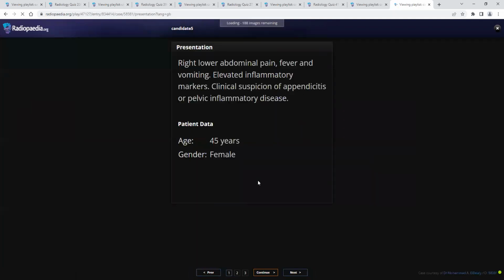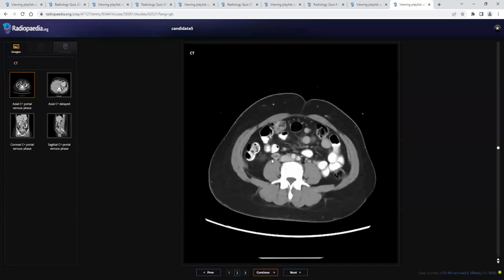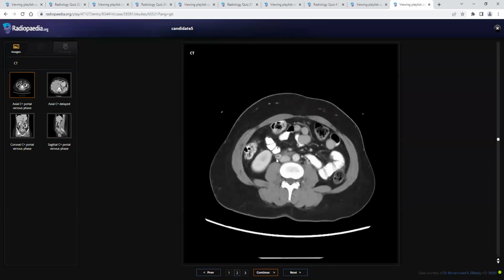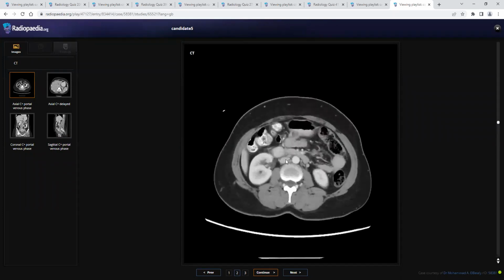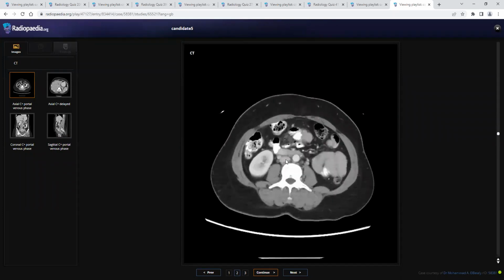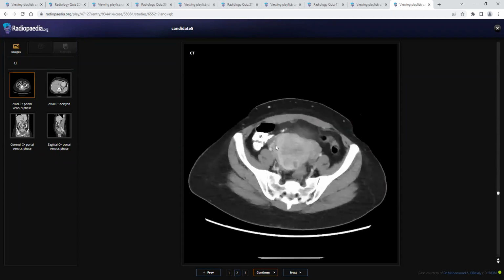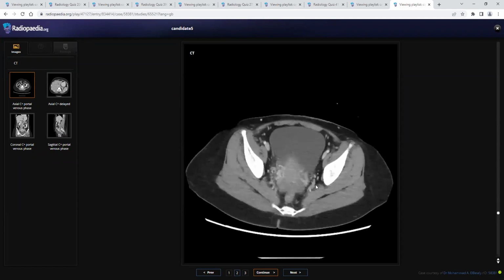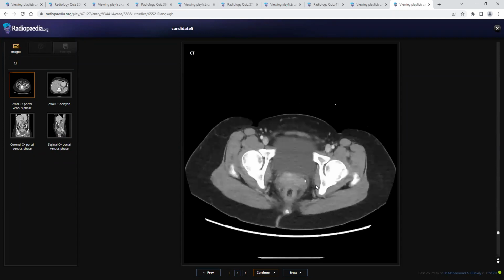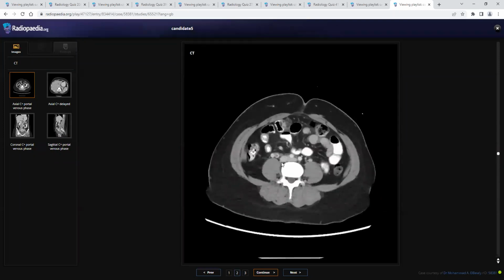And this is appendicitis. This is a case of right ovarian vein thrombosis. You can see this, this is the IVC. This is the dilated enlarged vein coming and draining to the IVC. So this is the right gonadal vein thrombosis, because there is congestion of the pelvic vessels. You can see bilateral parauterine vessels are engorged. There is pelvic inflammatory disease, and here she has got ovarian thrombosis also.